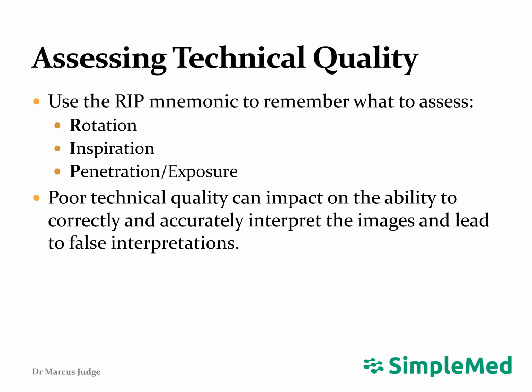We can use the RIP mnemonic for a quick and easy way to assess for technical adequacy, looking at the rotation of the patient on the film, whether the patient maintained adequate inspiration while the film was taken, and whether the image is adequately exposed or penetrated.